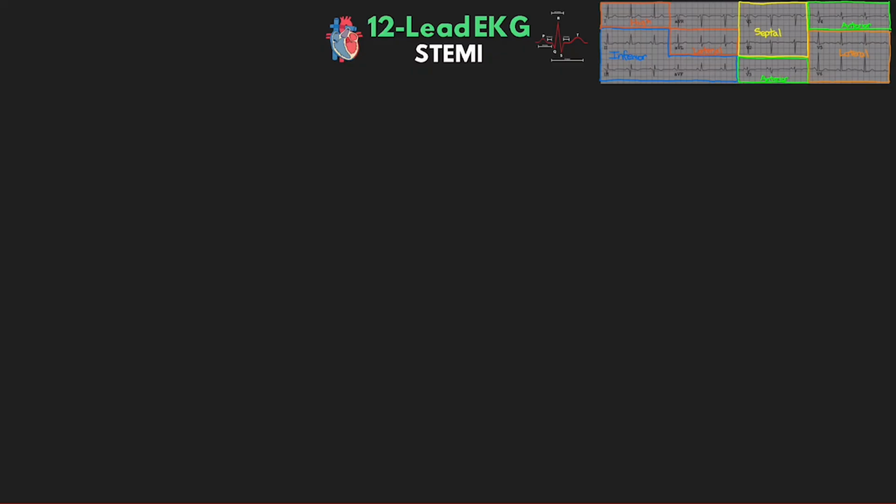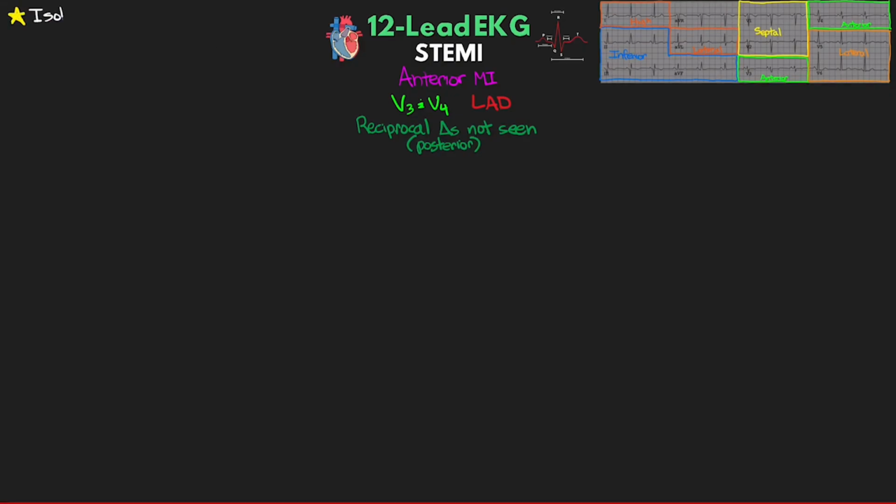All right, now let's take a look at an anterior wall MI. Remember that these are leads V3 and V4, and this region is perfused by the LAD. Reciprocal changes are not going to be seen as they would actually show up posteriorly, which, like I mentioned, we don't have a view of with our traditional 12-lead setup. Now, a true isolated anterior wall MI is actually pretty rare.